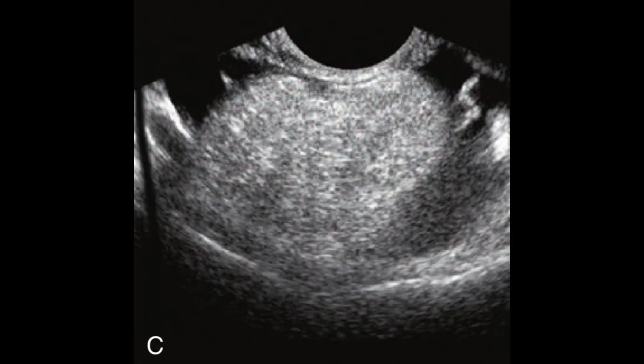If the clinician is expert and has seen all these types of dermoid lesions and cystic teratomas in his clinical practice, he may be able to pick that on abdominal ultrasound. But for an inexpert clinician, this would be quite difficult. So it is better to go for the transvaginal scan. Transabdominal gives you a clue. If you find that there is something wrong, and on palpation you still feel that there is some tumor lesion, go for the transvaginal scan. On the transvaginal scan you will be able to pick this type of appearance.